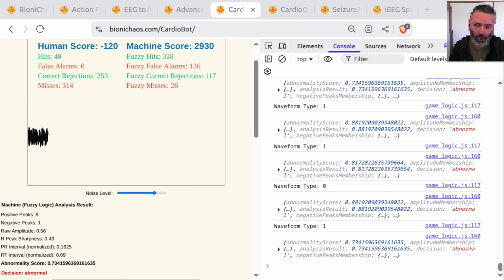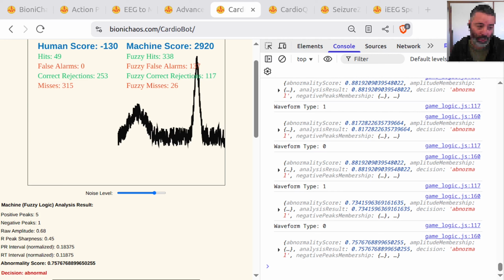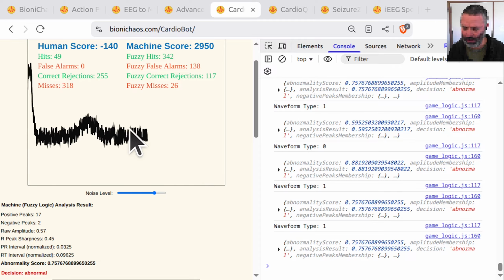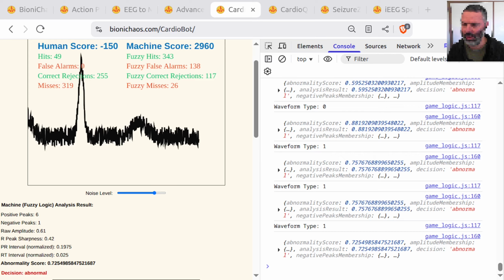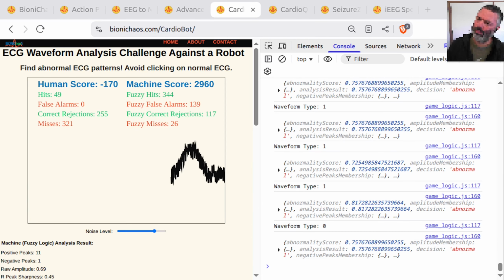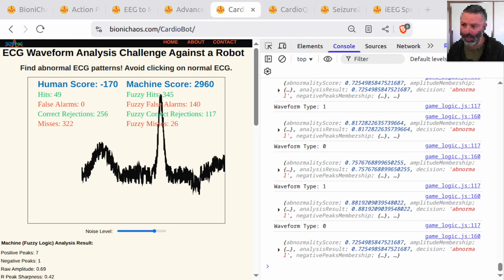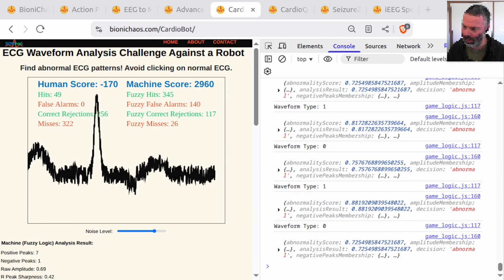a brief for another developer to do the coding. Okay, so we have a brief for developer. Trying to replicate. Why is it doing PQRST keys for quick segment selection? Is it hallucinating on us, or yeah, using Math.js? No external frameworks, so we're not using React or anything else.